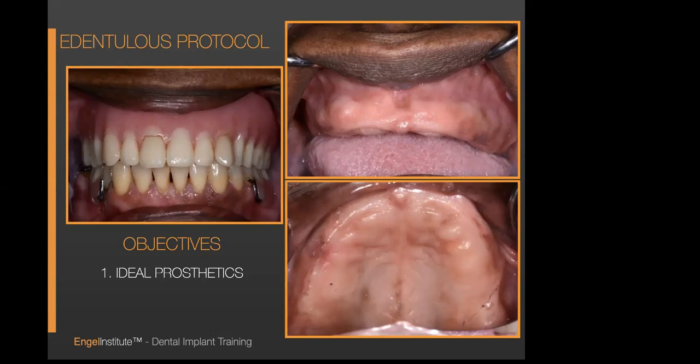Well, there's 2 things that are imperative, absolutely imperative that you do. I want to remind you, the way that this denture fits this person's mouth is the exact same way that the guide is. So when you see a denture like this, in your mind's eye, I want you to look at it and say, that's the guide, because that's exactly what it's going to look like minus the teeth. So what do we need to do?